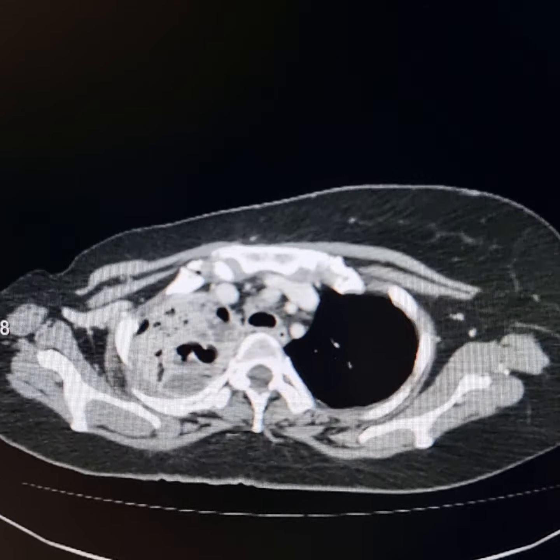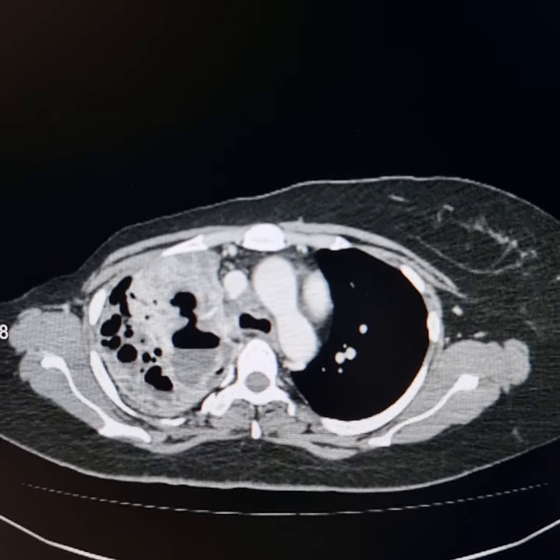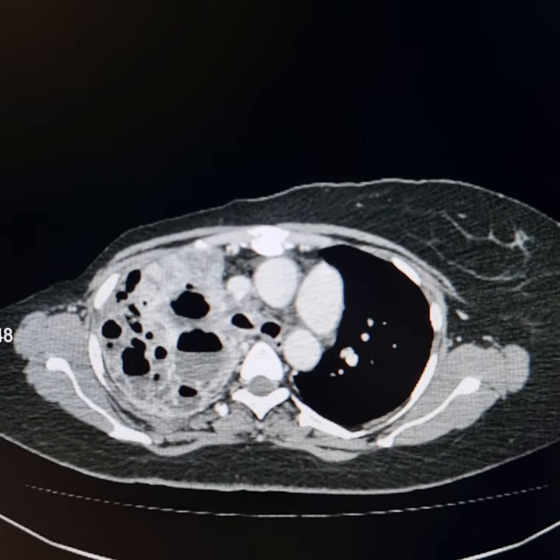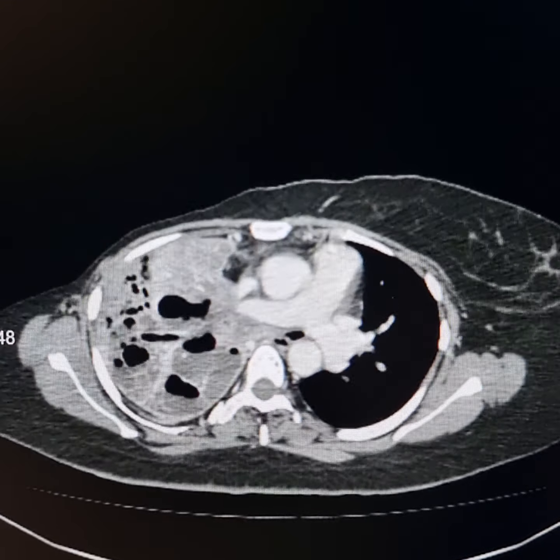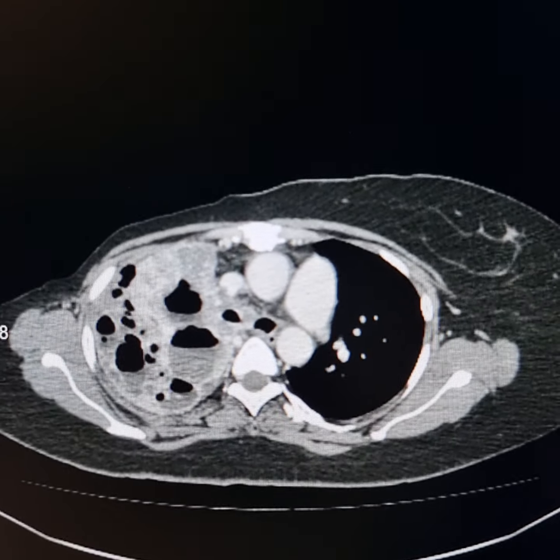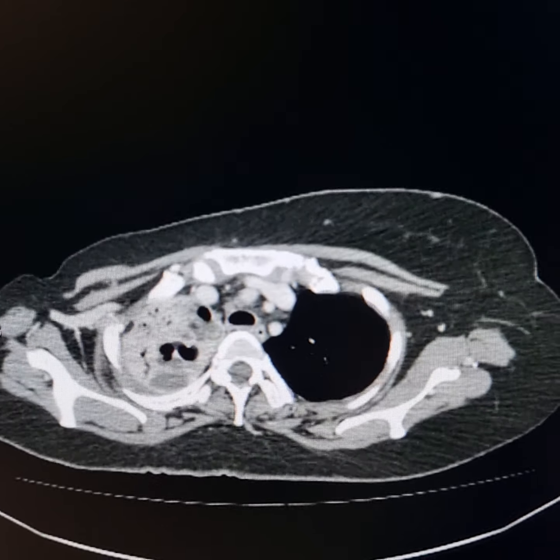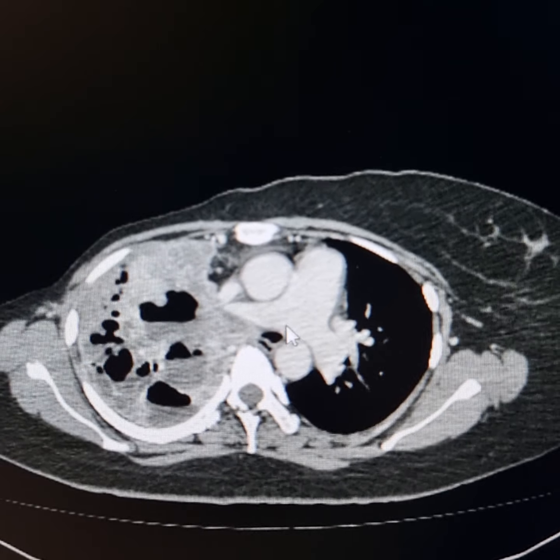This is a contrast-enhanced CT scan of the chest and abdomen of a 34-year-old female. She is a known case of carcinoma of the right breast. Mastectomy was done in 2019. She remained symptom-free. The patient had courses of radiotherapy and chemotherapy. Now, the patient has developed a metastatic lesion in the right hilar and infrahilar region.